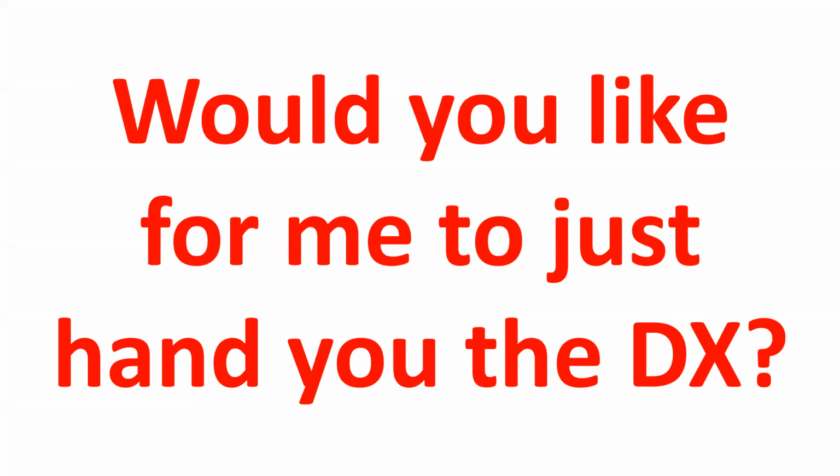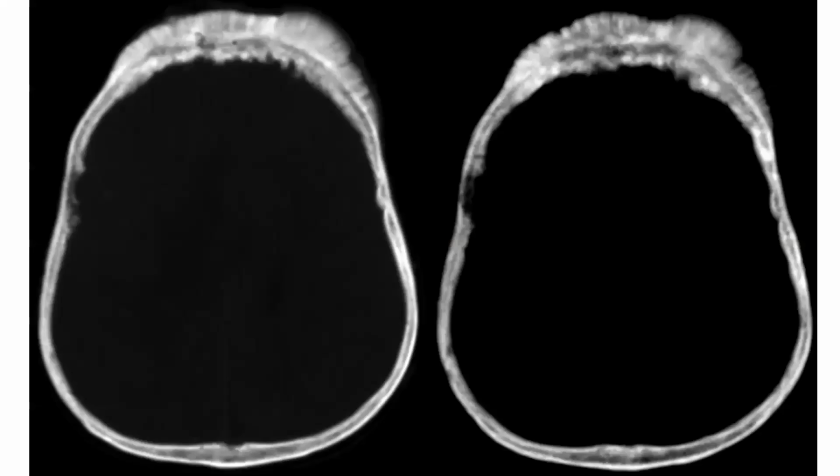Here's another. Okay, I put this in. Would you like for me to just hand it to you on a platter? There. Better? Would you rather I just showed you this first? What are you seeing? What's it called? Anyone want to chat in? Yeah, starburst. Very good, Andrea Gilbert. Starburst. What's the other name for it? Starburst sign. There's another name. Thank you, Dr. Cathcart. Hair on end sign. Now, starburst hair on end is not specific for meningioma.